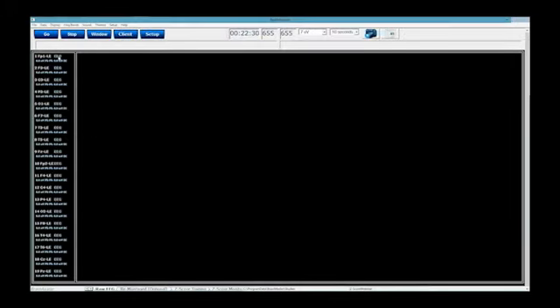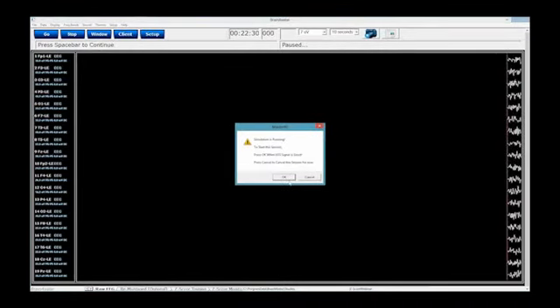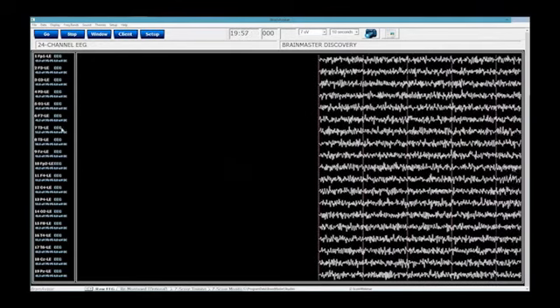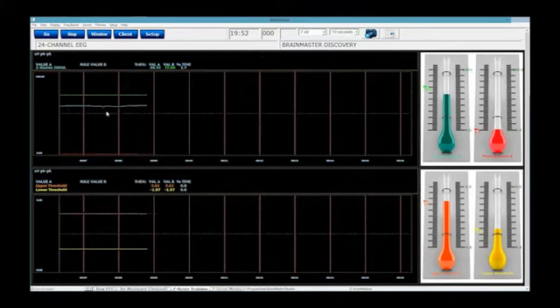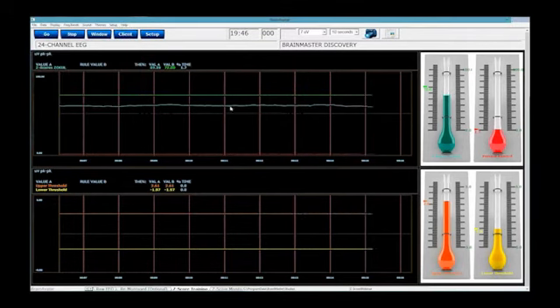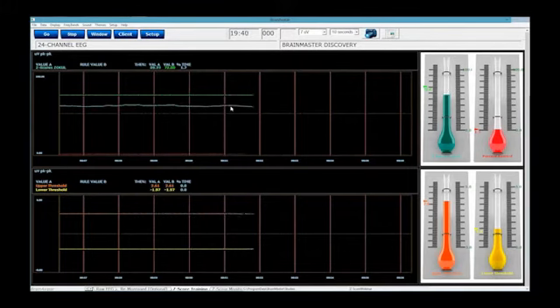Okay. So now I'm going to run this in simulation real quick after changing this to 19 channels, and we can look at some of the biggest differences that occur with this. One of the biggest differences is on this page where you used to see 4, you see 19. You're not going to see that much of a difference, except for one thing. You're going to notice that this screen is usually a little bit flatter than what you notice with 4 channels, or even 9 channels, or anything less than 19 channels.